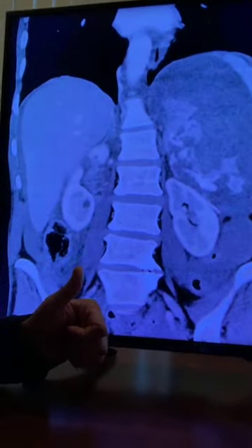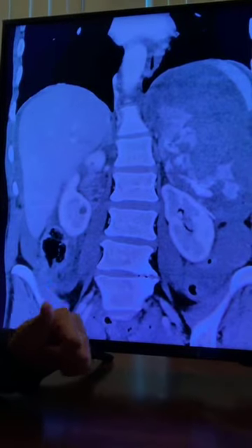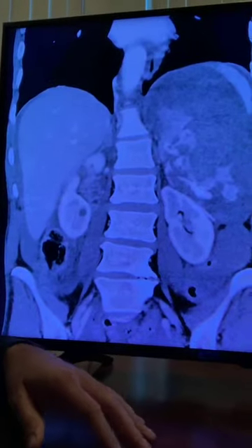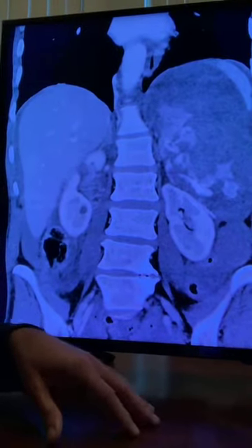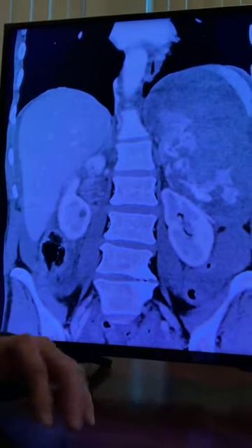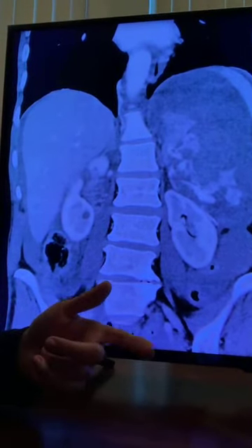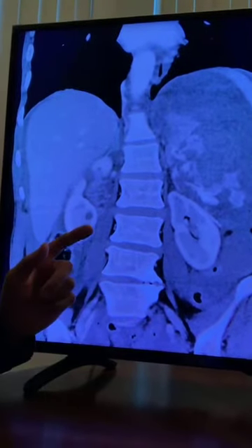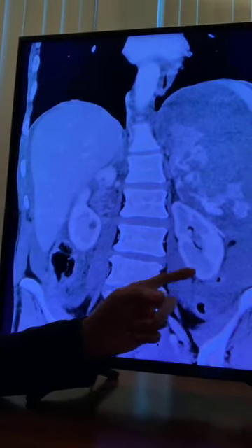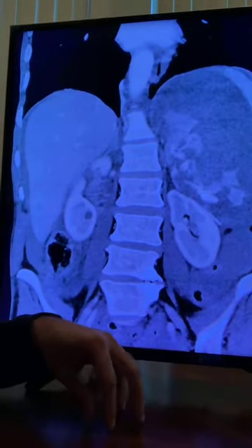So we got a CT scan. Now we have to ask ourselves, is this contrast enhanced or not? And how do you know it is with contrast? Some people can say, well, look at the vessels. The vessels are opacified. Sure, I get it. What if you can't really tell with the vessels? Sometimes when patients are too obese, it's not really easy to see with the vessels. What other things can you look for? All right, Sean answered again, look at the kidneys. But what specifically about the kidneys? Yes, the kidneys are bright, but what specifically about them makes you know that this is a contrast opacified exam?